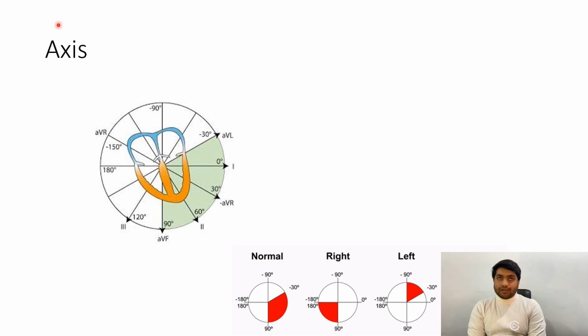Later on, I read the ECG. Everything seemed fine except the axis, which was deviated to the right side. So the only clue that we had that he had some heart pathology was his axis deviation. So every time you see that the axis is deviated to the right or left, you should pay very keen attention to it and look for any pathology in the ECG.